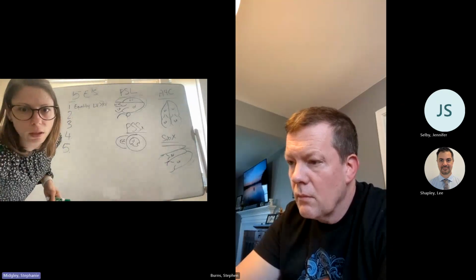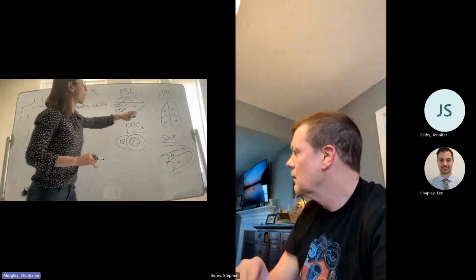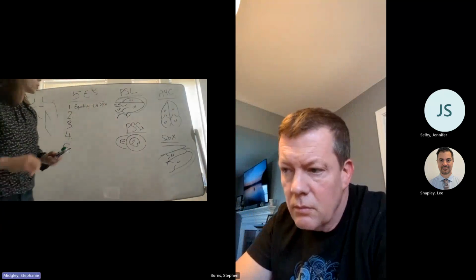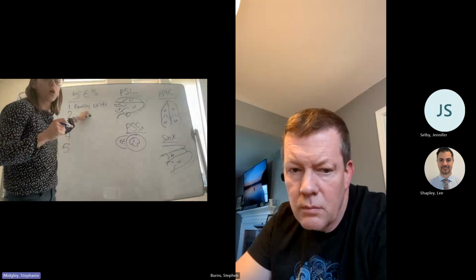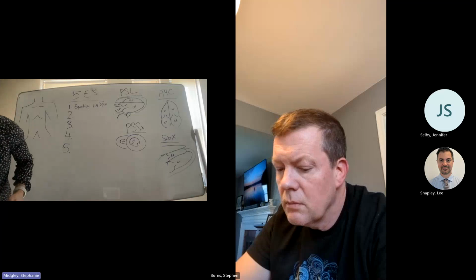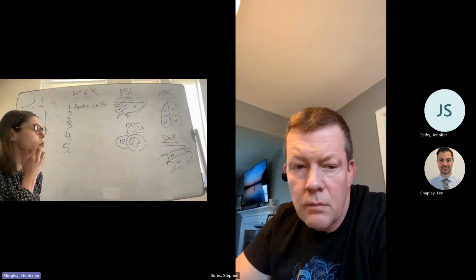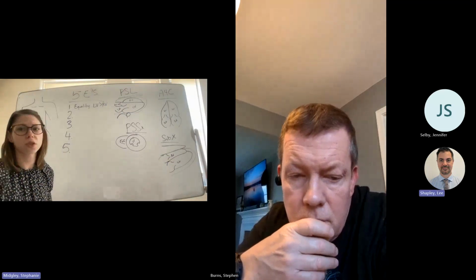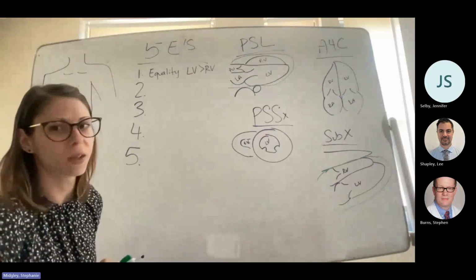When I'm looking at my different views, I want to be able to figure out which views are my best ones for equality. Let me just, sorry, back up for a second. When I'm looking at equality, I'm trying to really look for signs of right heart strain. So if I have somebody that has a PE or is coming in with symptoms of a PE, say shortness of breath, chest pain, dyspnea on exertion, God knows how many PEs I've admitted to cardiology. I'm very sorry. Very good at missing them.